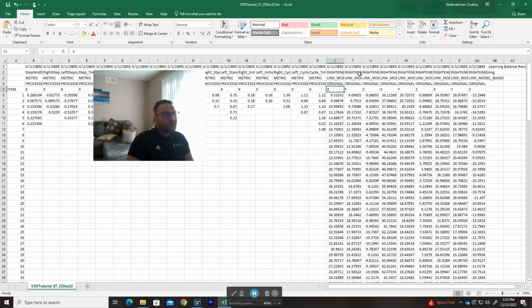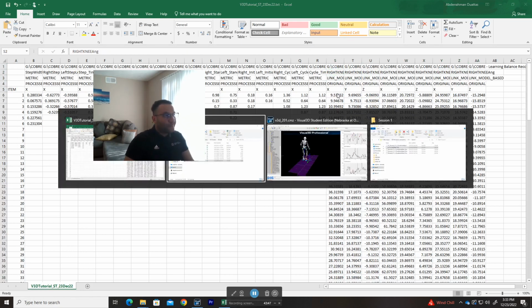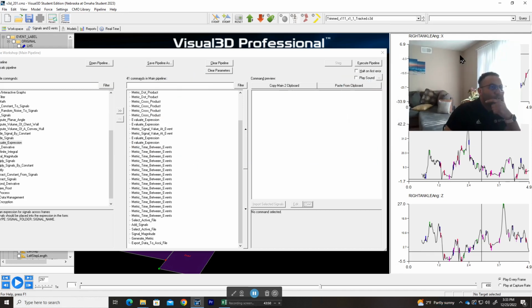Why did it export the right knee angle 3 times?